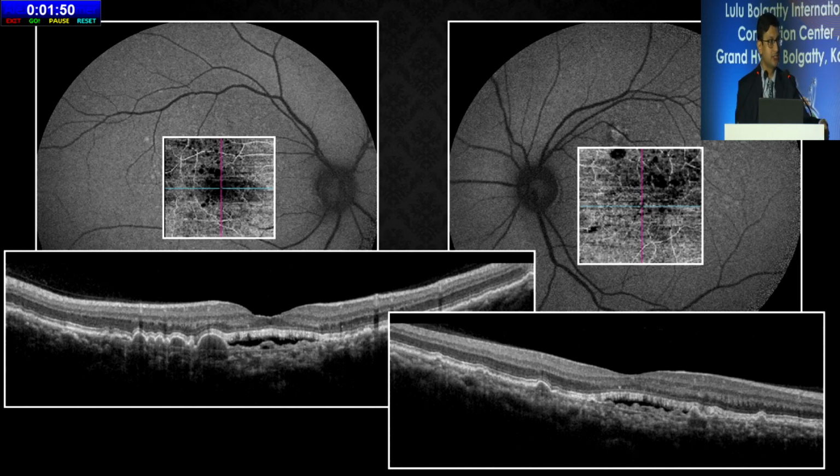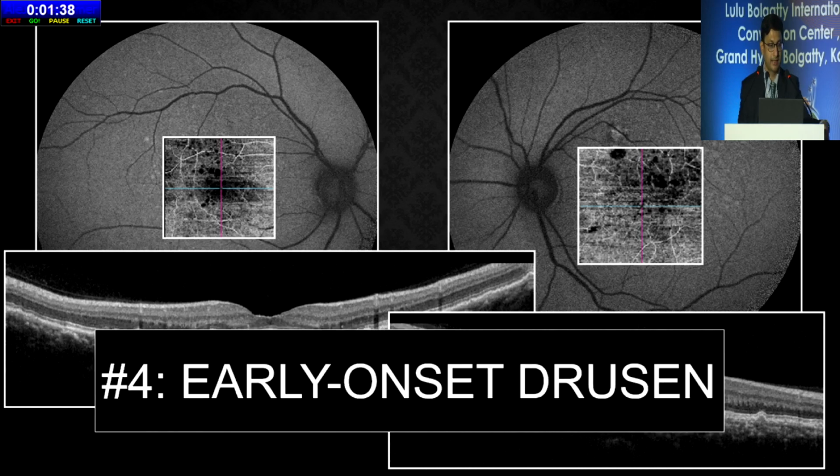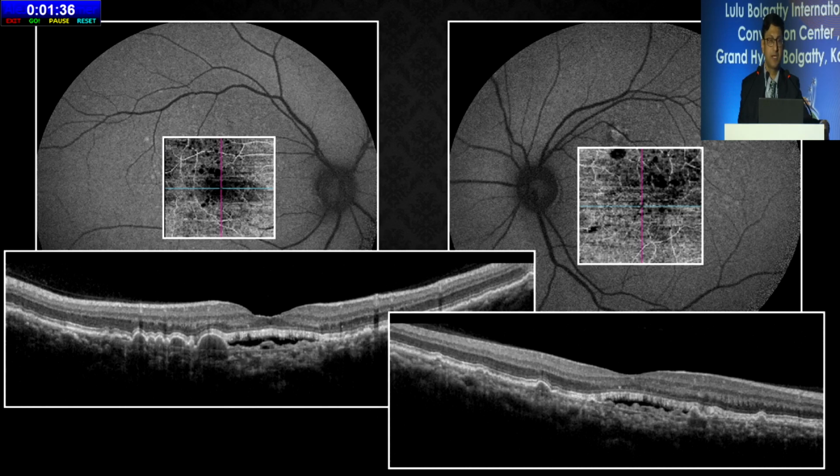So before you start injecting, just hold on, do not inject. And I would say just follow up these patients with OCT angiography periodically to make sure of what you're treating. So do not be very prompt in treating with anti-VEGF. This patient came back with the same OCT without any change in the fluid 6 months from the initial follow-up without any treatment.